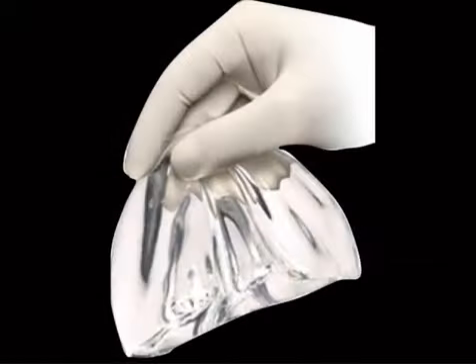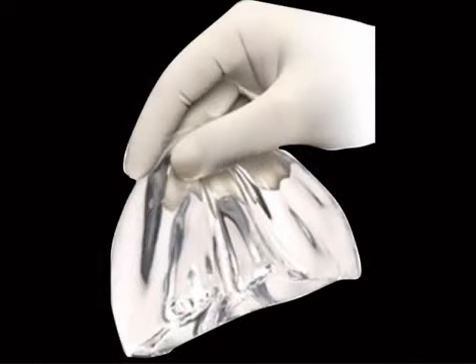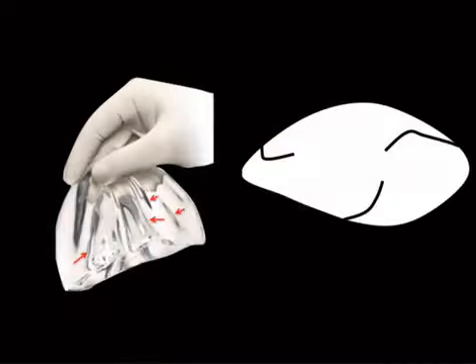All right, so let's look at these again. I'm going to go through each one and explain it. So this is an implant before it's put inside of somebody, and I just want to point out that there are these areas of infolding. And if you would look at this in cross-section, it would look something like that. And then here's our case.